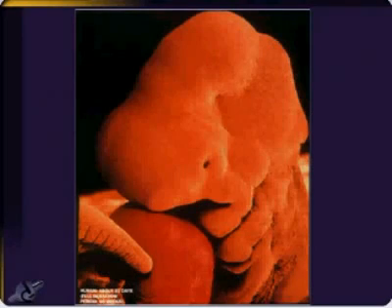Why can we see the heartbeat so darn early? You can see a heart beating before there's even anything to measure. That's why that 5 millimeter measurement is actually quite generous. Well, this is you in your salamander phase of development. Here you have little gills here, little tail coming around, and you're wrapped around this basketball. And that basketball is actually your heart.